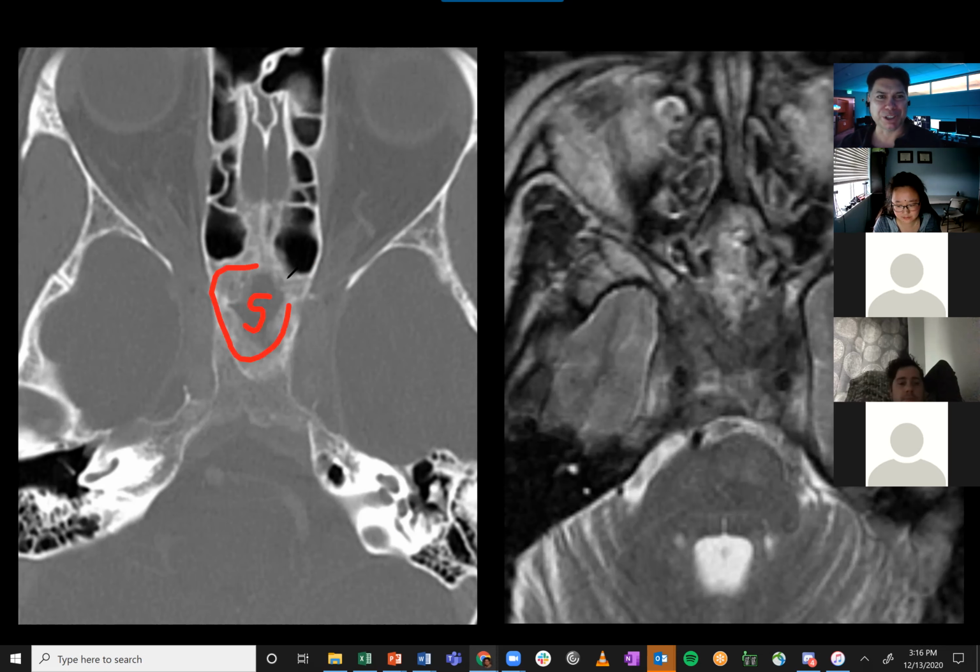We used to call it mucoperiosteal reaction, but it turns out the mucosal surface is technically normal. So we call it neo-osteogenesis or osteoneogenesis. So infectious looking stuff is going on in the sphenoid, and both cavernous sinuses are too big. Okay, so the MR, this is a T2, CSF is bright. What do you think about the cavernous sinuses there on both sides on the T2? Looks like they have a heterogeneous signal, and there's probably some infectious debris within them. And is it bright or dark? It's dark. Dark on the T2.